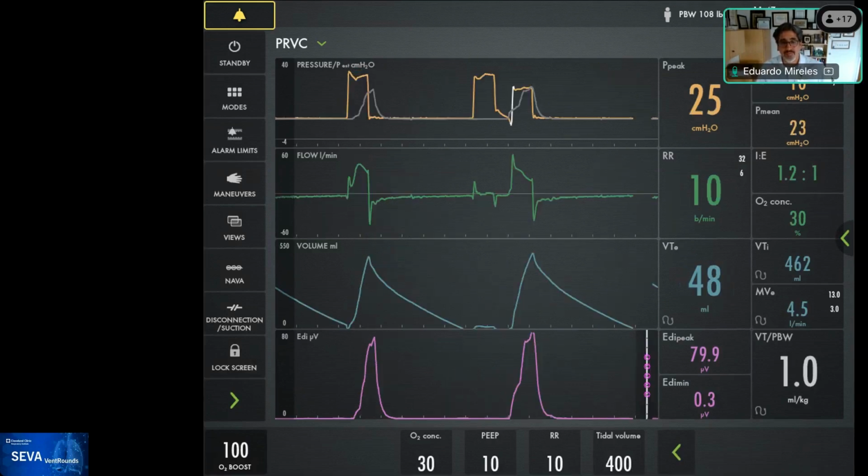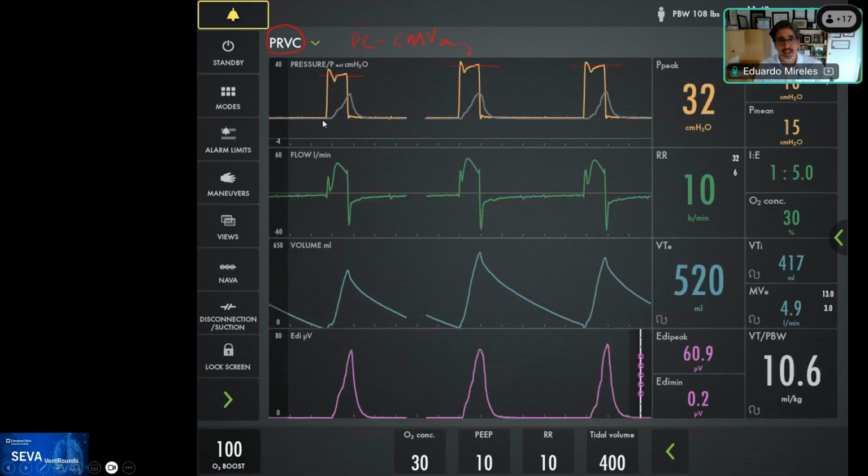You got to see, again, this algorithm of the adaptive targeting and how it changes the pressure throughout. Again, several examples of early trigger, with different timings, so it may occur very early or very late.